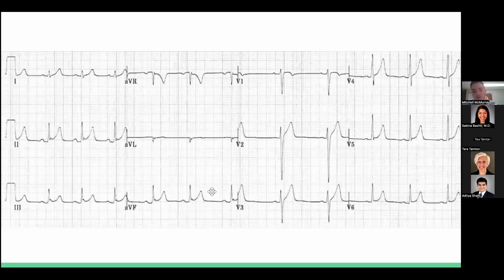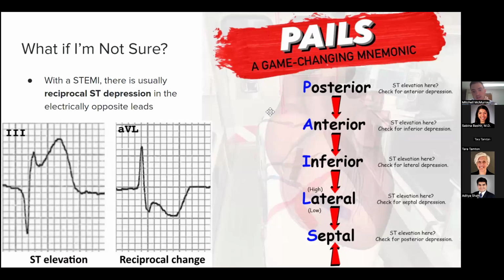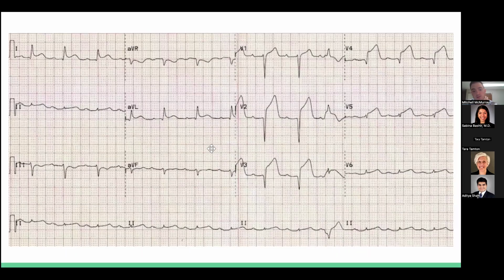Contrast that to this, which is ST elevations in the anterior leads, and then depressions over here, some T-wave inversions. That's concerning.